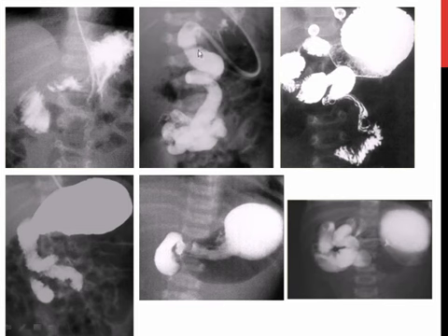And if you have an abnormal Z-like course of the duodenal jejunal junction, if your duodenum doesn't go up to the level of the gastric antrum, if you have this Z sign of mild proximal dilatation with an abnormal course of the DJ junction and further loss of the luminal diameter, and if your jejunum is to the right of the spine, consider malrotation with volvulus.